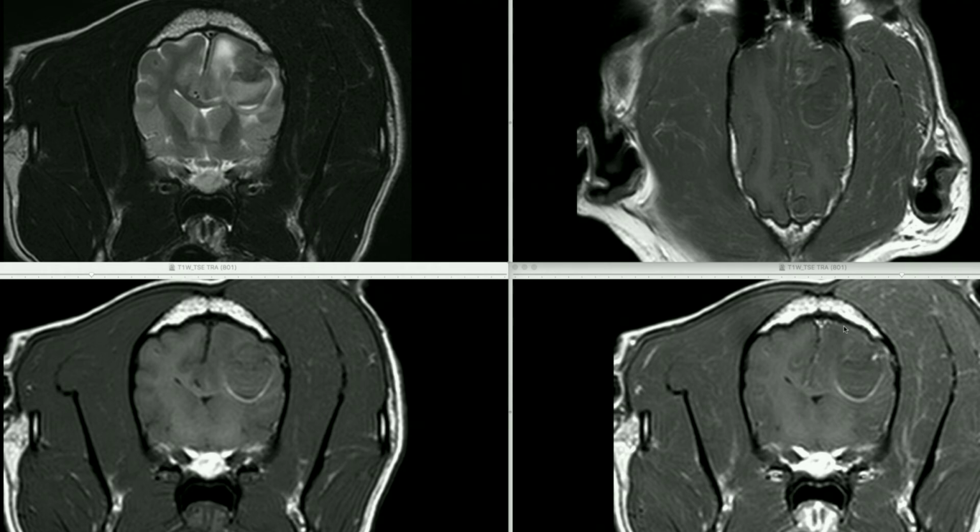So these features would be a pointer that this is likely to be underlying neoplastic disease as opposed to benign hemorrhage. With benign hemorrhage due to coagulopathy, we'll often see evidence of hemorrhage elsewhere in the body. So often we'll have a clinical suspicion, as there may be bleeding sites elsewhere in the body. But in this case, the appearance of the lesions is more suggestive of a malignant cause for these hemorrhagic lesions.